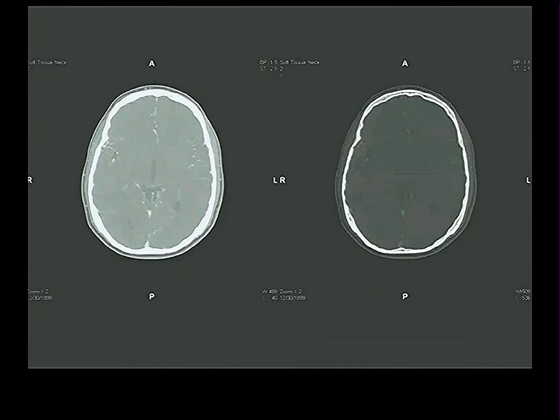Now, when you look at CTs, you know this from when we look at the heart and the lungs and things like that. You can have windows which show you bones very well and vessels very well, or you can have windows which are sort of softer. It can show you the lung and things which are less radiodense. So this is maybe a standard CT that we looked at of the skull. This is one which is emphasizing bone and making all soft tissue structures very, very dark.